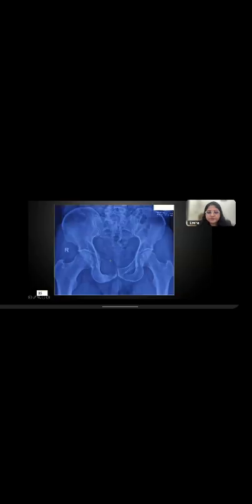Case 23. Another example of melorheostosis. So small things like these you should be able to pick up. In the second proximal phalanx of the second digit also melorheostosis is there, and a large area of dripping candle wax type of appearance, cortical in location, smooth. And on the AP view you would also be able to see the melorheostosis.